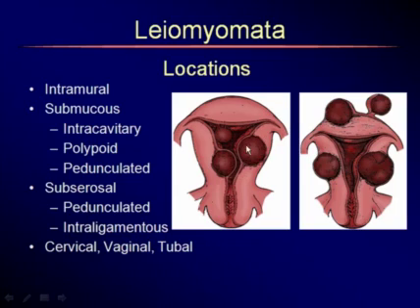If you describe a fibroid such as this one that has less than 50% submucosal component, but only has a very thin couple millimeter covering of myometrium, they will think twice about removing this hysteroscopically because the rate of perforation here would be quite high. They may want to use ultrasound during the procedure or may attempt something else, another therapy.